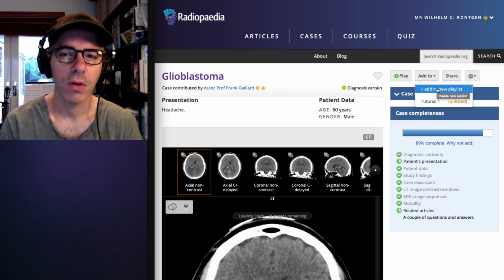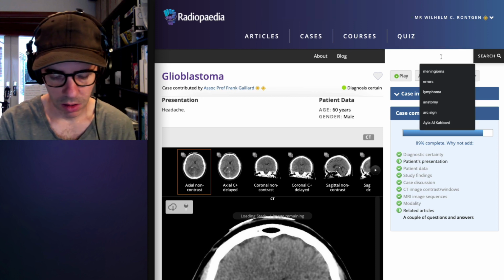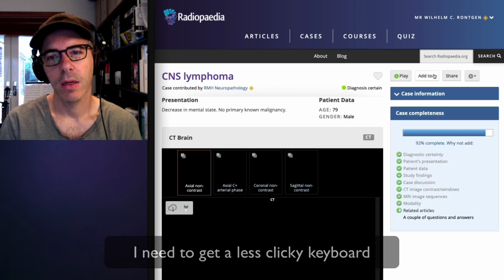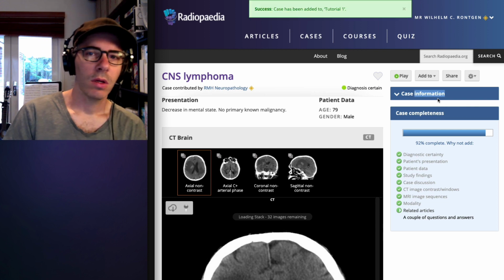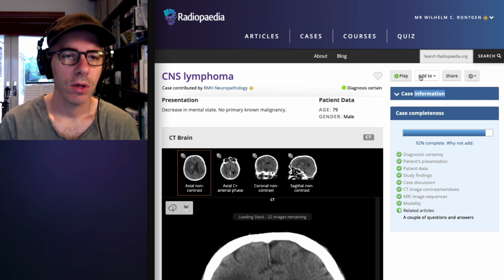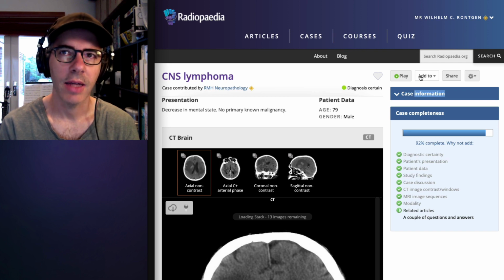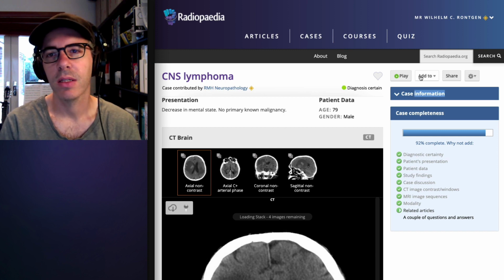So now that you've already got a playlist, you can add to the existing one, or you can make another one. So I'll just add maybe one more thing, CNS lymphoma. And again, add. So if you wanted to use your own cases, you can then keep your cases unlisted and add unlisted cases to unlisted playlists as well. Otherwise, you can use any public case for anyone.